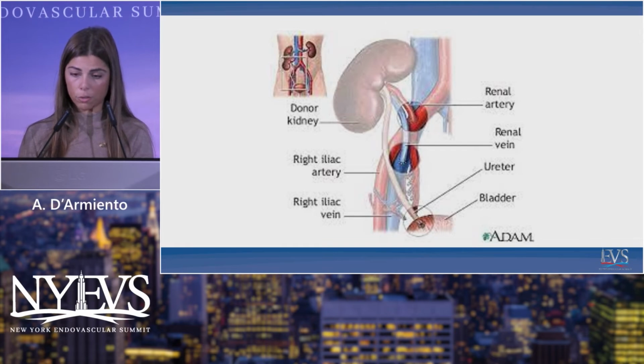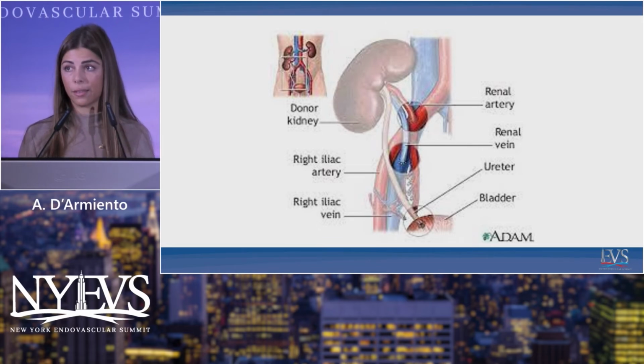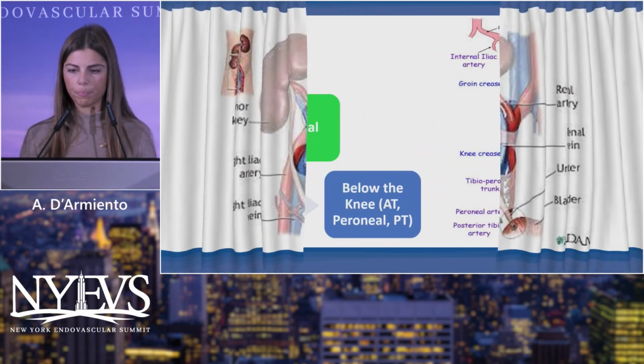because as you can see, the transplanted kidney is just above the femoral access site, and we can risk the integrity and cause damage to the graft, which we can all agree took a lot of work to get. So please take this into consideration, and please advocate for contralateral access when available.